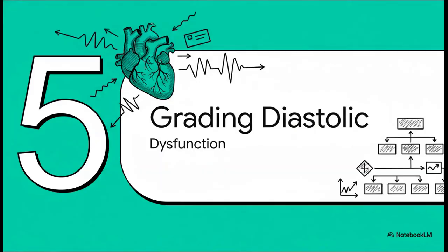All right, this is a really crucial part of our session. You have all these different parameters, so now what? How do you put them all together to come up with a clear diagnosis and actually grade how bad the diastolic dysfunction is? It might seem complicated, but there's a very clear step-by-step process we can follow.